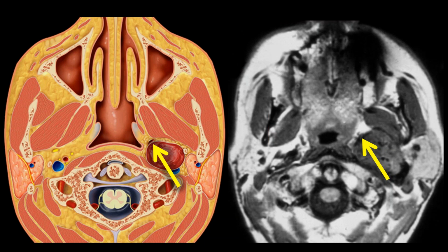So I think very closely about the fat in the extracranial head and neck. So those pre-contrasted T1 images are very important for me, and they're much more important than sometimes the SPGR or the FSPGR or the MP-RAGE imaging that may obscure the fat in the marrow and the bone or in the extracranial head and neck. So every time I'm looking at a suprahyoid neck study, I find that fat.